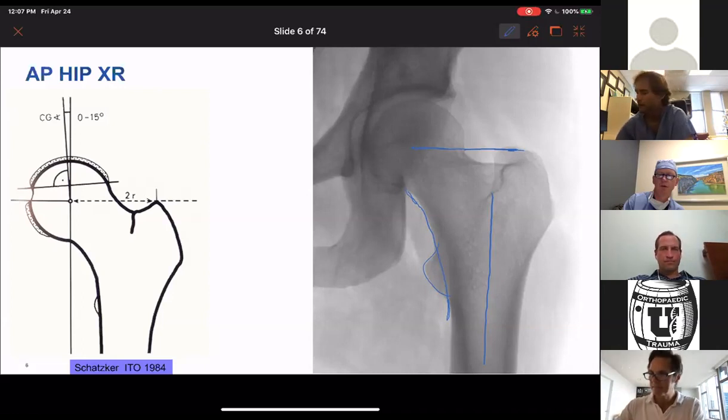Fifth, there is a particular shape at the superior aspect of the femoral neck coming out onto the shadow of the greater trochanter. And on a true AP view, that particular shape is typically maintained. Now I'm going to show you some examples of radiographic anatomy, just normal variations in anatomy or mild pathology that are going to affect that. But for the most part, when we're looking at an AP of the proximal femur, we're expecting to see a particular shape at that location. You might say, well, who cares? Why does it matter what the shape is there?